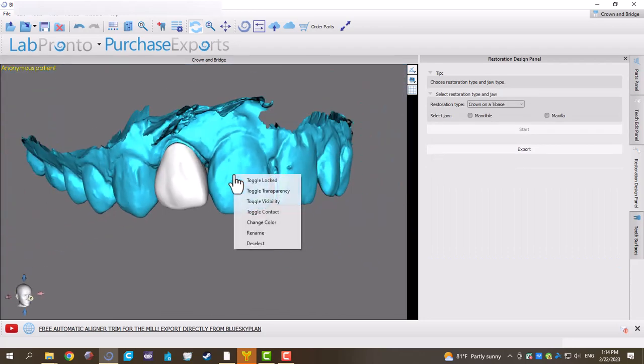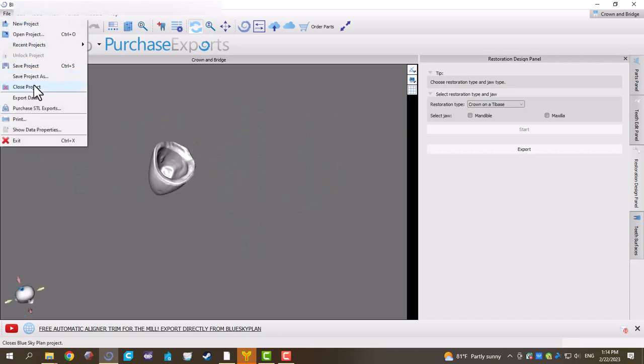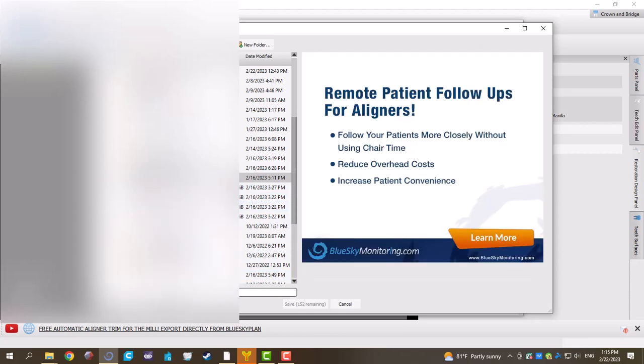And wonderful. Within about 5 minutes, I have a crown that I can export to this young lady's file. I will print it off on my SprintRay. For her, I'll probably be using the Cure A1 resin. And yeah, I'll have something out with her in about 30 minutes or so that's ready to pop on in. Thank you for following. Appreciate it.